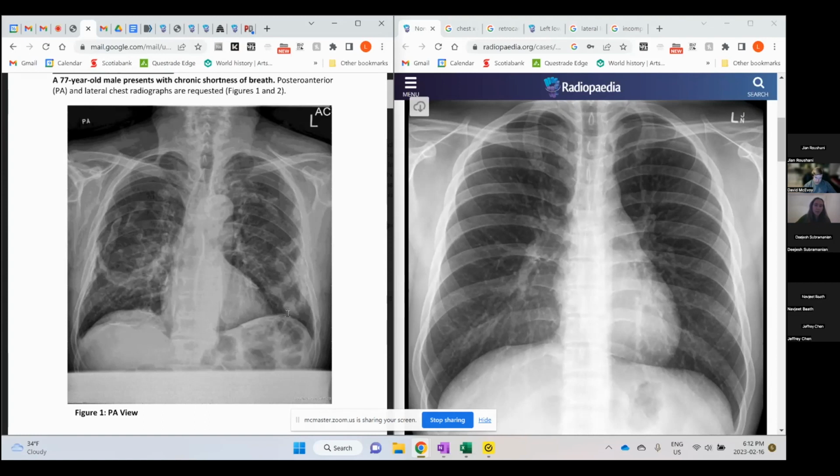Another thing that you could add is that they're very dense, because I would never expect a pneumonia, for example, to be this dense, like this edge here. It's almost as dense as the bone. So that's also helpful to include because it will build towards our final differential.